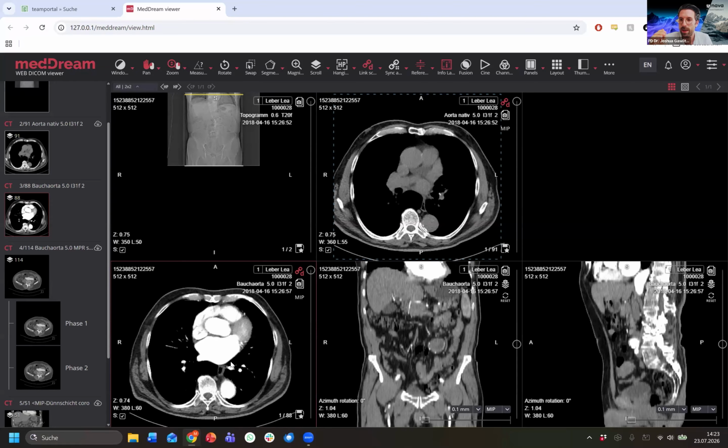But in the end, it could theoretically happen at a customer that different radiologists or different medical staff looking at the images have different pixel interpolations activated, right? So this is just a small hint. It's not important for you. You can also see it as a feature, but I would make customers aware if they are asking what this new feature means: that all these interpolation techniques have their ups and downs, but please make sure, if you're doing this institution-wide or organization-wide, that you have a common ground on what to start with, right? But as Raimundas already said, it is also possible to do this within the settings, so that you have a common ground.